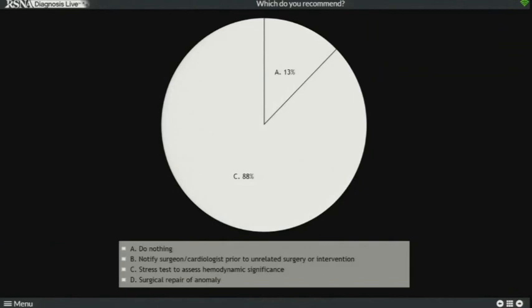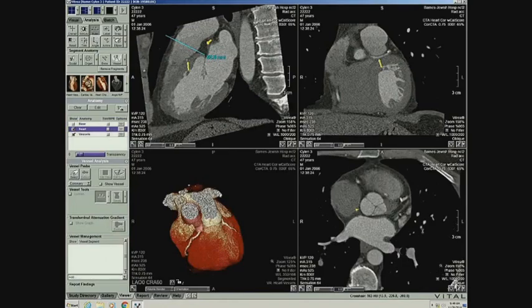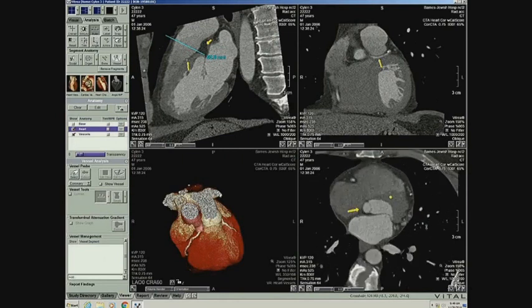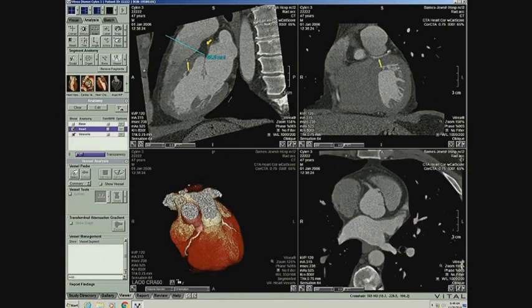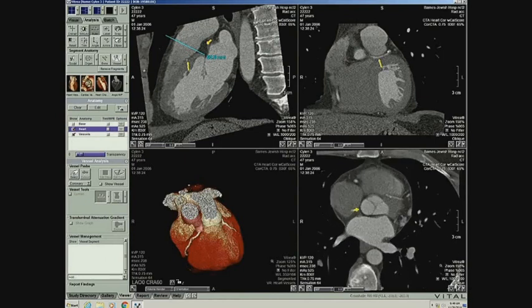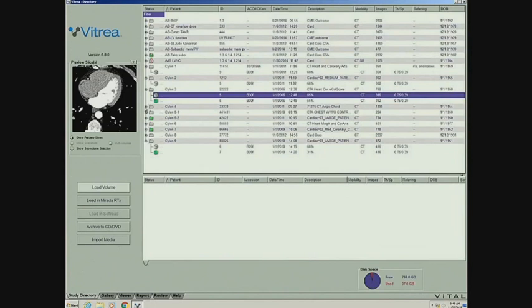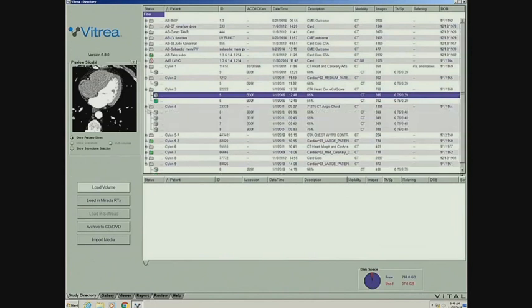Okay, so this is very good. So basically, we always say the septal variant usually is something that doesn't cause an abnormality, but if this is a patient, 47 years old, we find no other atherosclerotic disease, has real problems, symptoms, and so there's some disease here, but if that was not stenotic, so the question would be, is this a flow-reducing anomaly here? So the patient would require stress tests. Very good. The next case I'm going to show you here is this one.